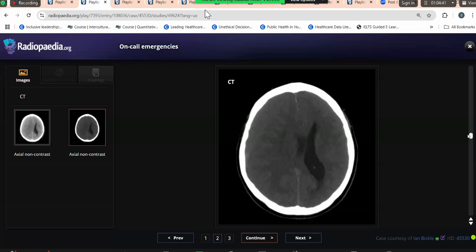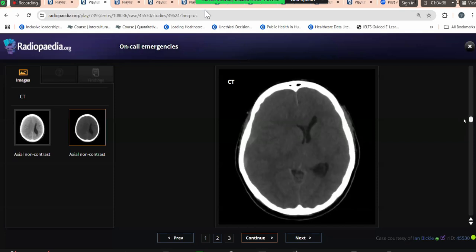So in this provided window, I can... Sorry, I didn't appreciate what you said. What did you say? You will review what? Sorry. I will review the same in the subdural window just to confirm my findings.